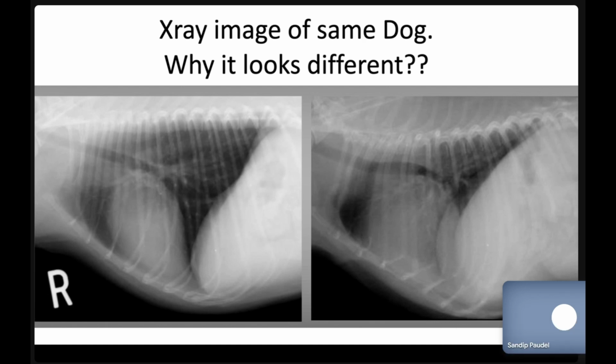These two images: one with inflated lungs and another without inflation. If it is possible, it's always better to take the X-ray with the inflated lungs.